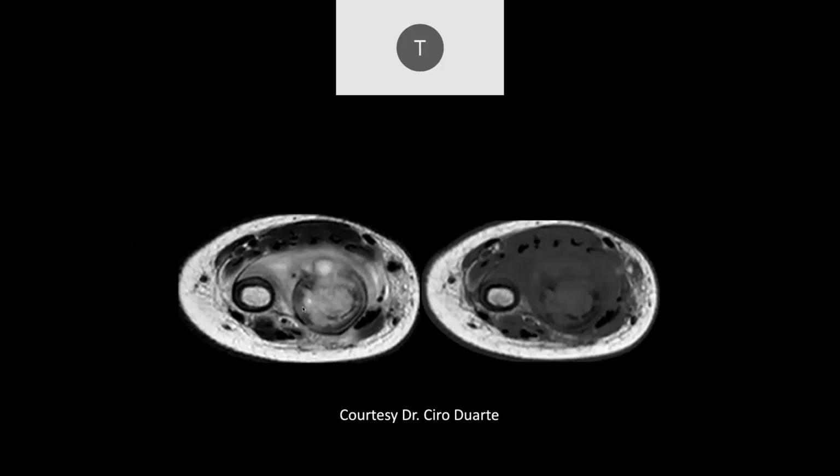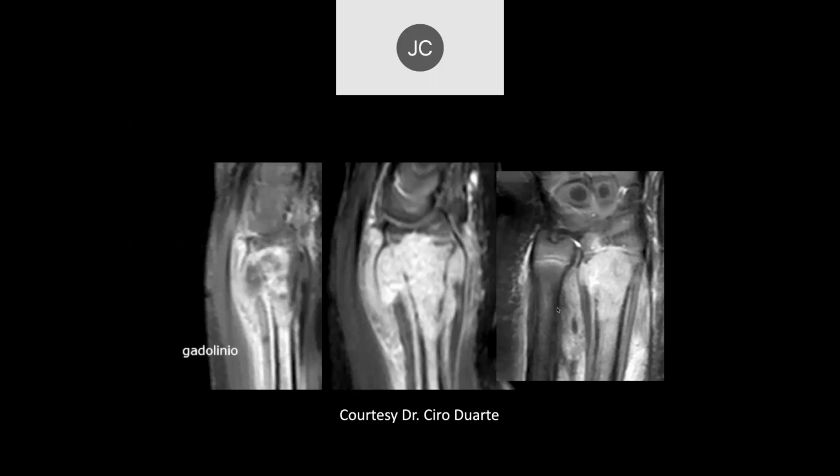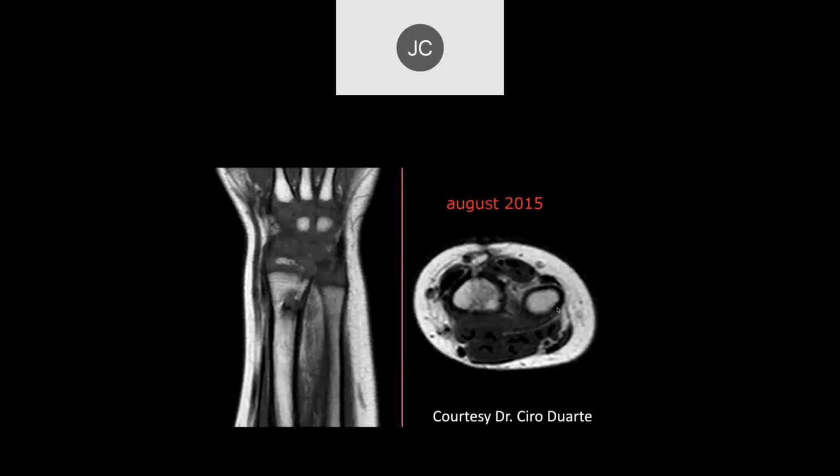We can see some hypertrophic bone formation here, maybe part of an involucrum. And then here we can see the soft tissue extending all the way around both bones. Definitely. Okay, so that was then. Now 10 months later, this is what it looks like.